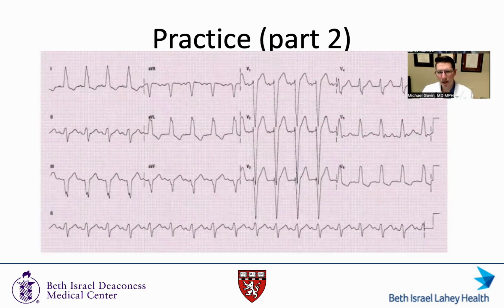So now thinking about left bundle branch block, we see a small, sharp R wave here. And that small, sharp R wave is the forces coming from the right ventricle going towards the left ventricle down the septum. All right, so these are septal forces. Sharp septal forces down the right bundle, very fast, very narrow, activating the septum from the right side. And then everything thereafter gets dominated by the leak over to the left side.